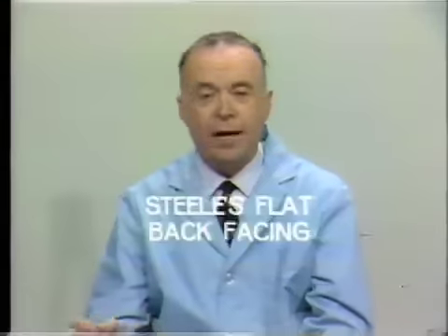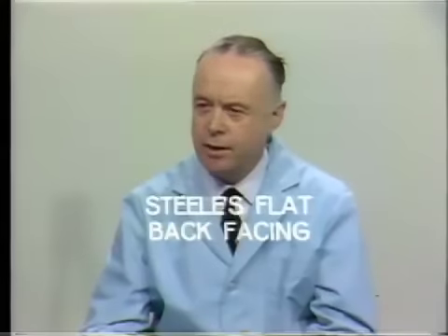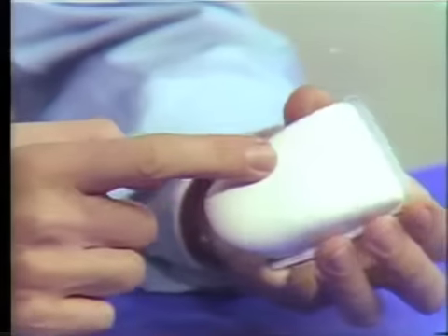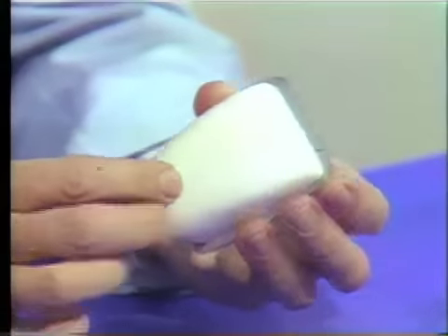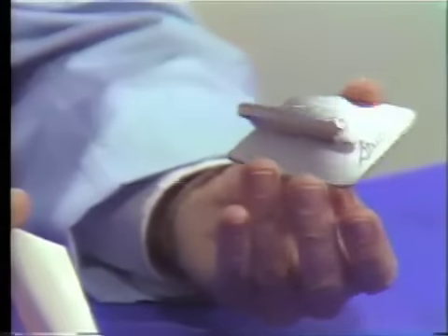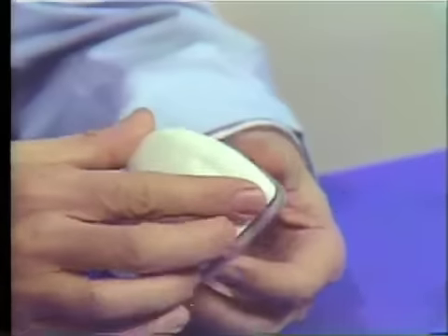The Steele's Flatback is another type of Pontic which utilizes a prefabricated facing. And this model which I've got here, I think, illustrates the principle of the Steele's Flatback quite nicely. The facing here, which can be either normal porcelain or vacuum-fired porcelain, or can be resin facing, slides on a precious metal backing. This is an enlarged model, of course. And the method of securing the facing is to cement it in position on the backing.